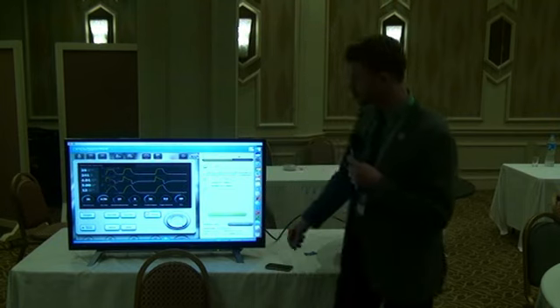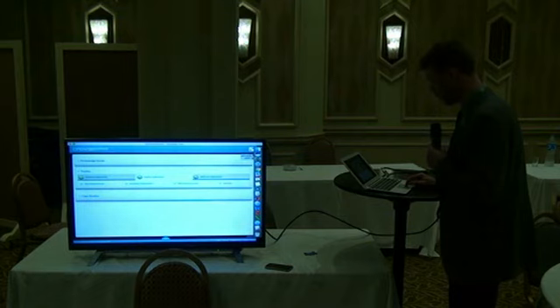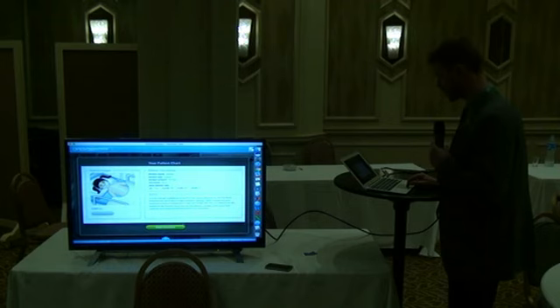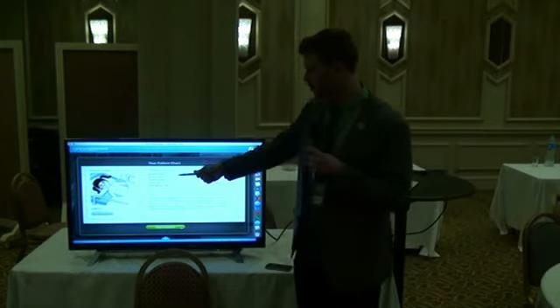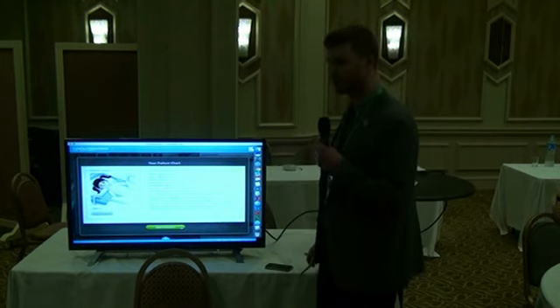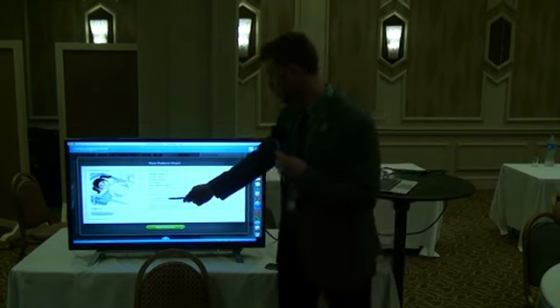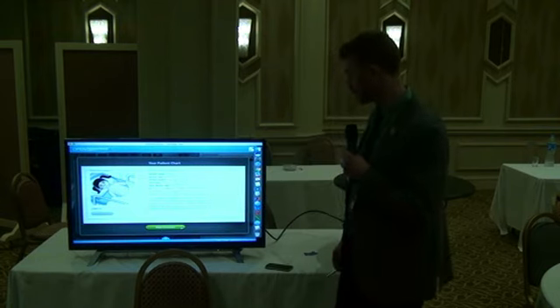Okay. So I think we have probably just one more case, and then that will be a wrap. But let's look at, hopefully you didn't see what I just clicked on. All right, last case. A 6-year-old, but it could happen to anybody. Could happen to a 900 grammer, could happen to your great-grandparents. But we have a 6-year-old admitted to the PICU, severe pneumonia, so relatively ill from a pulmonary perspective.